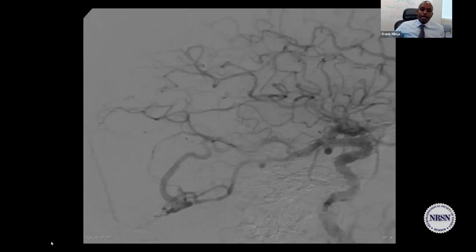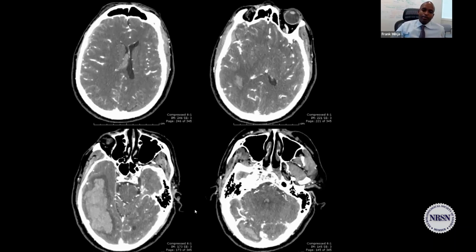They go on to have an angiogram, and an angiogram is going to be super selective, and you can see a nidus, a large draining vein, and a large feeding artery, right? Again, this is a tiny thing. This is probably like a 1 centimeter AVM, but look at how big of a hematoma that thing caused. So AVMs are really, really bad actors. Why?